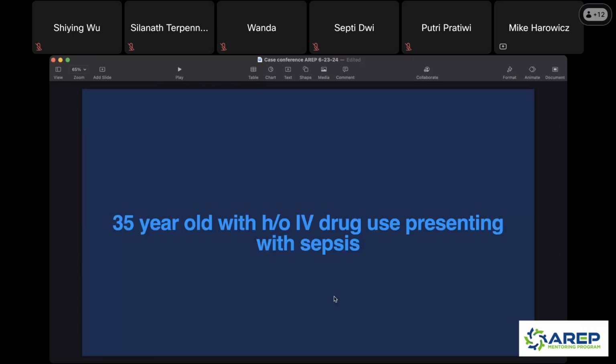All right. Well, I'm glad I know that now. We'll stay on this so everyone can see my arrow. And if the arrow goes away, please somebody yell at me and say, hey, I can't see what we're talking about.